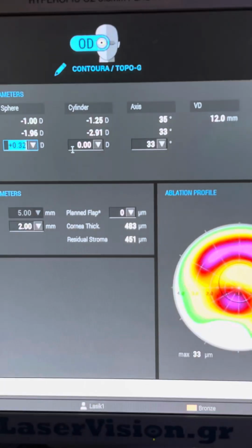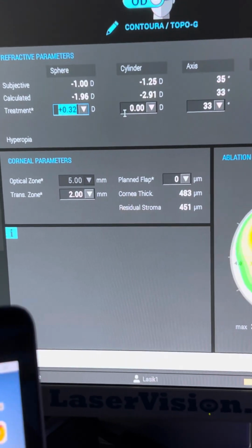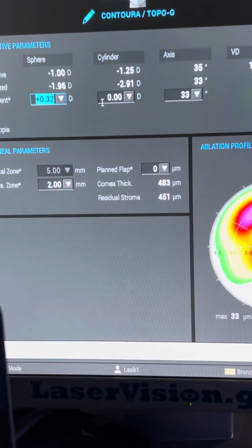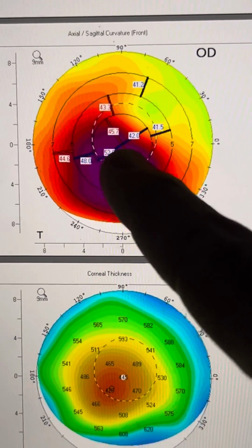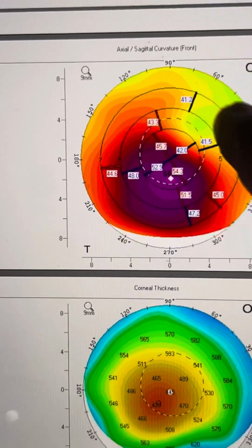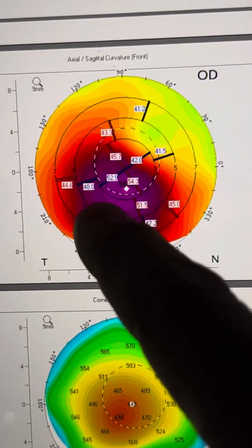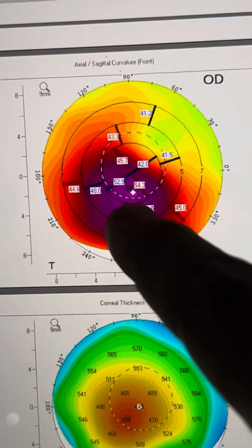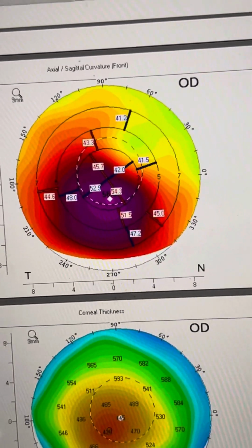So by reshaping this cornea, we're probably going to end up having some residual myopia left over, which for the patient may seem as if myopia has been created. Because in the refraction, the patient picks probably a sweet spot somewhere along these lines, which does not represent the actual steepest part of the cornea or the cornea thickness. And you can see here how the patient has shifted the angle kappa in order to be able to view through here, and that's not the center of the cornea.